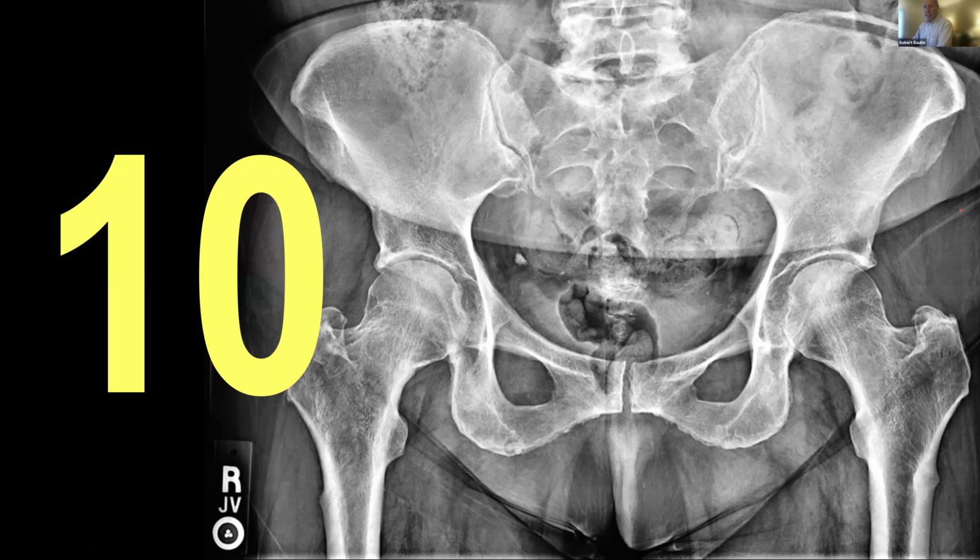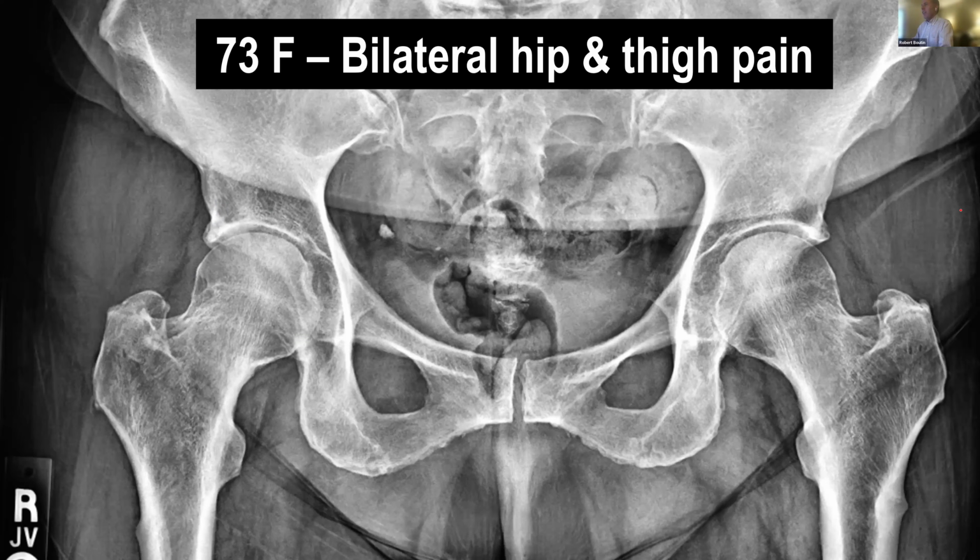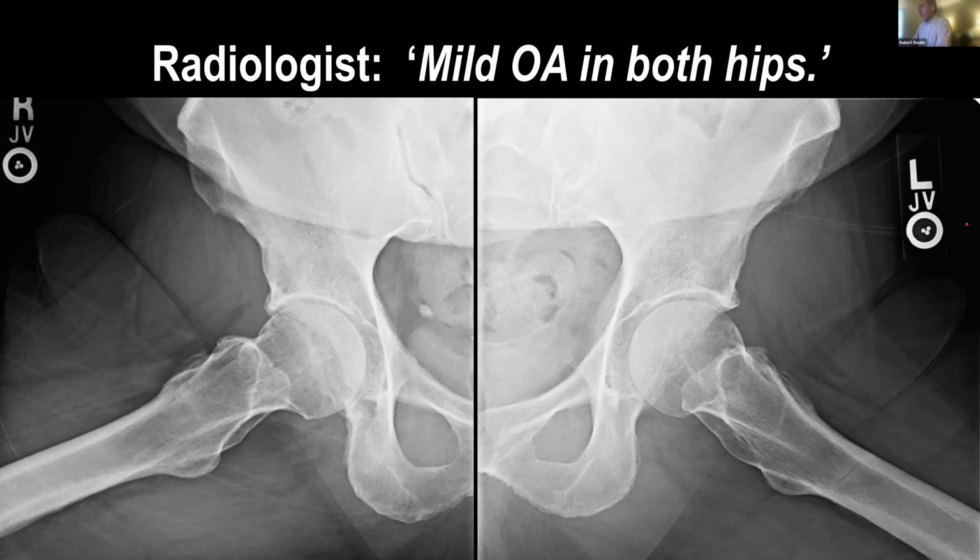All right, moving on to this patient who was trying to work out, an older person. She had really been trying to take care of herself, 73 years young, and taking bisphosphonates for her osteoporosis.